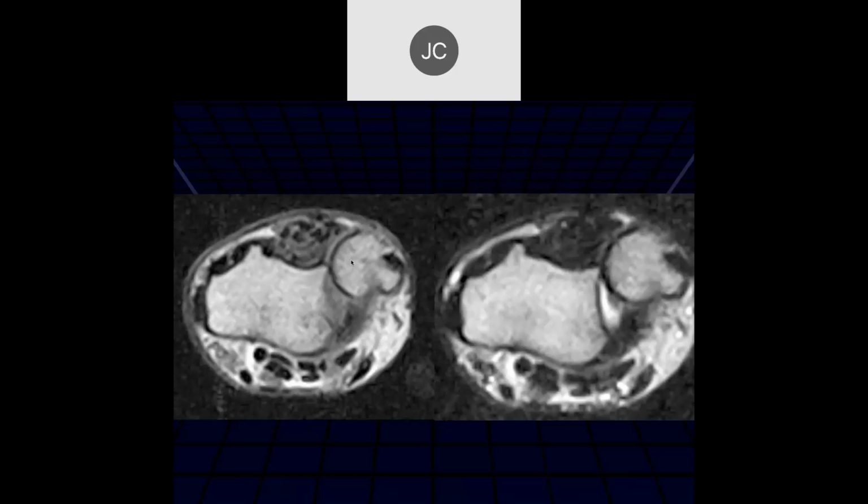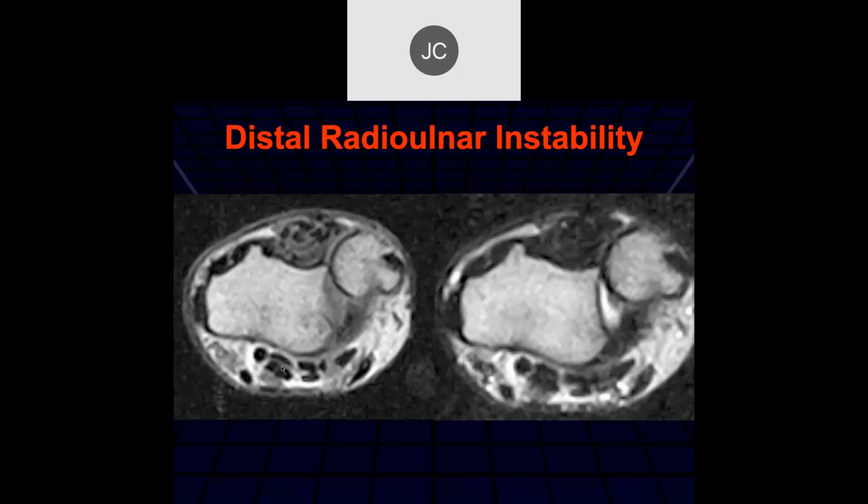But you know, if there's even a lot less displacement than this, I would raise the question. But this is definitely abnormal when you get to this stage, and there's probably a lot of tendinopathy here of the fourth extensor compartment as well, and maybe some tenosynovitis of the flexor tendons.